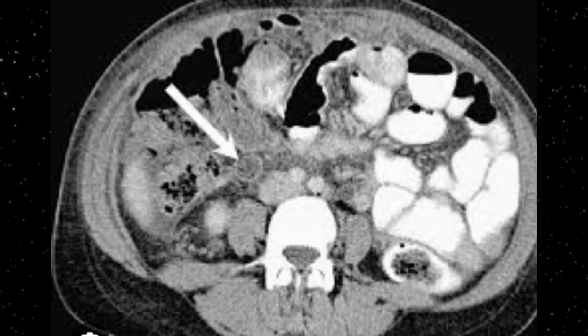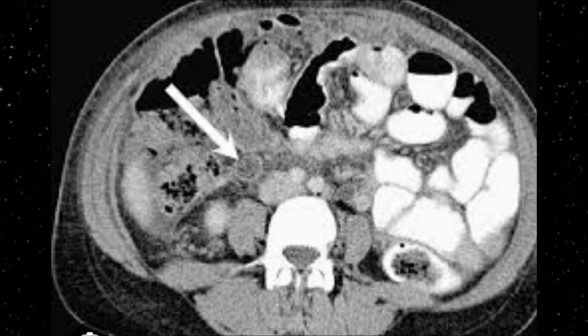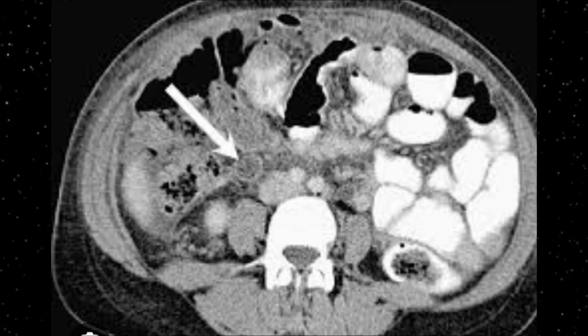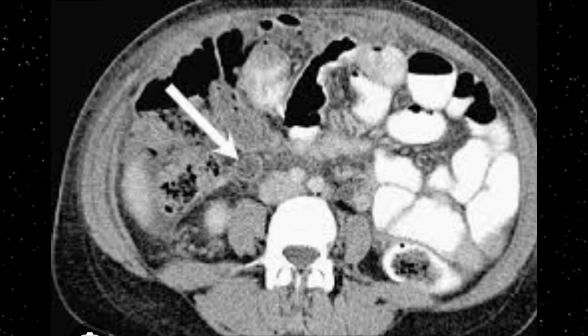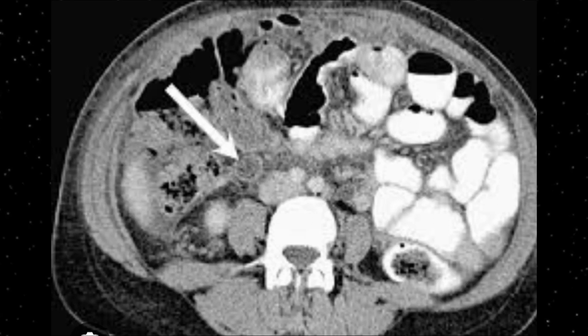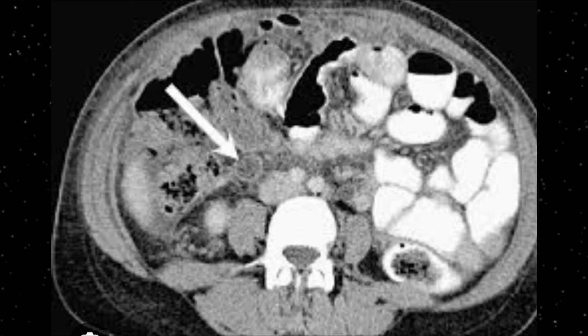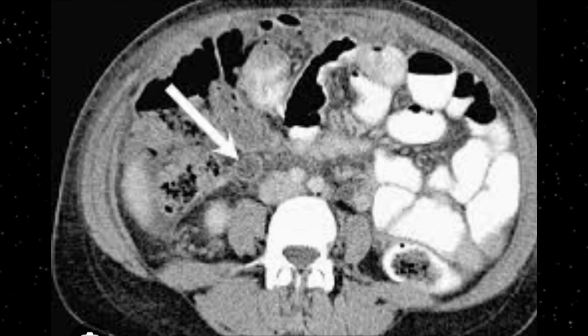Just a quick example on the CT abdomen axial images. Here on these axial images you can appreciate all the structures. Bowel loops are visible, and beside this, that arrow is indicating intraluminal thrombosis of the right sided ovarian vein. This ovarian vein is occluded by the thrombus, and beside this, enhancement of the surrounding wall can also be seen.